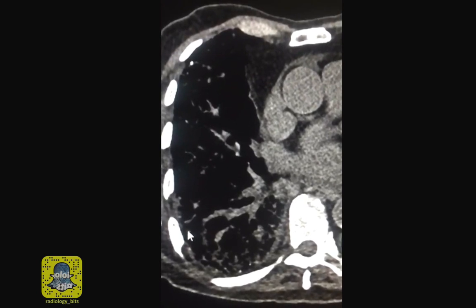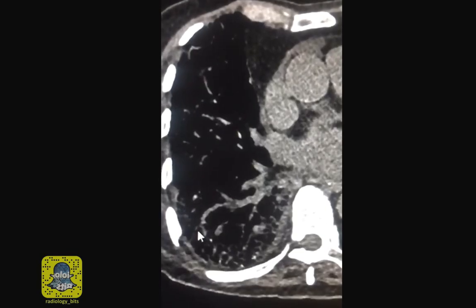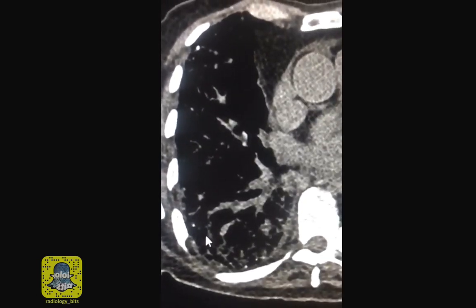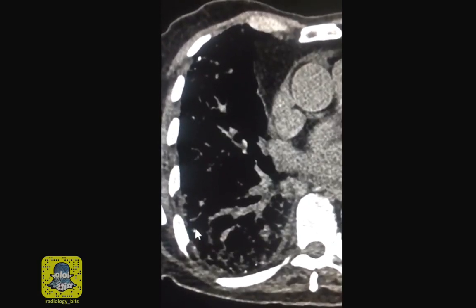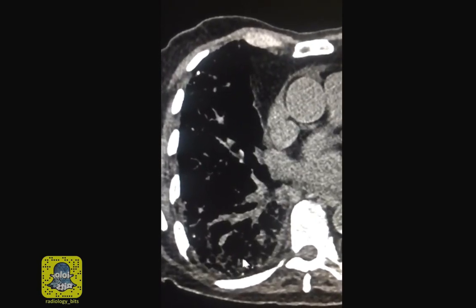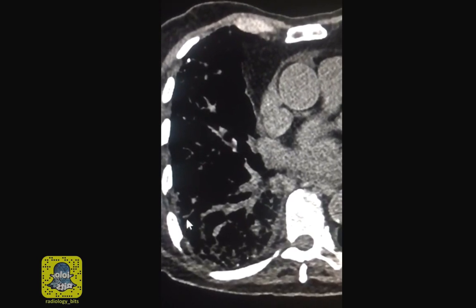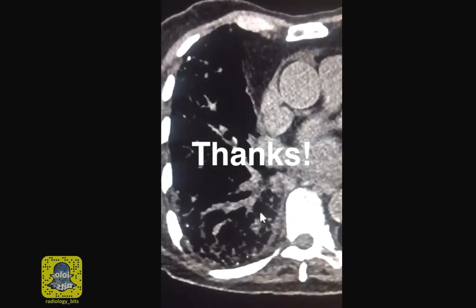So if you see what seems to be ossification, this tells you two things. First, this is not a granuloma, and it might not mean previous TB infection. Second, like in this case, it tells you that there is a long-standing insult, and this is another feature that confirms the fibrosis here. To summarize, if you see calcific foci within fibrosis, think about pulmonary ossification. And remember, this tells you that this is real bone from a long-standing process, and it's not old infection from tuberculosis. By that, I end this case.